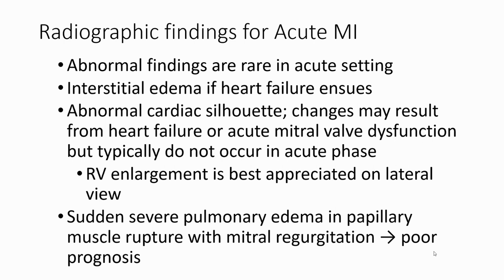In radiograph, acute myocardial infarction usually is rare to show any abnormality in the X-rays. But if it causes heart failure, we can find signs of interstitial edema and abnormal cardiac silhouette.